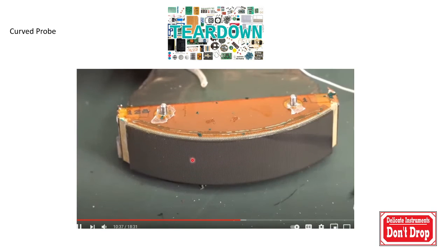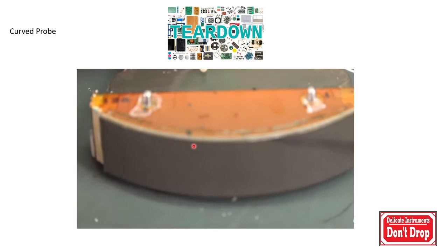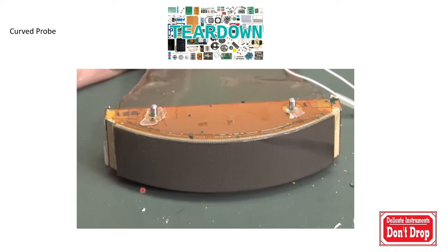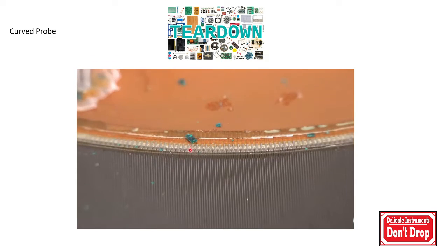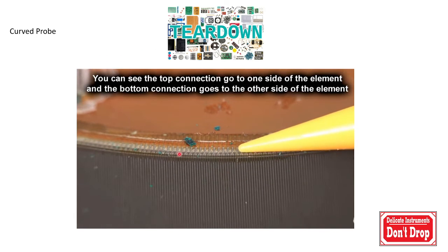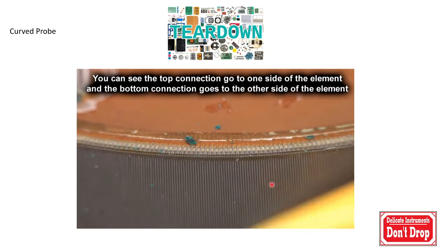At this point, there are small linear sequential piezoelectric crystals, and each of these crystals is connected by an electrical circuit at the top and the bottom. So the current passes through these microcrystals, and this is a linear sequential probe. The connections are at the top, and what you see here are the piezoelectric crystals which are arranged.